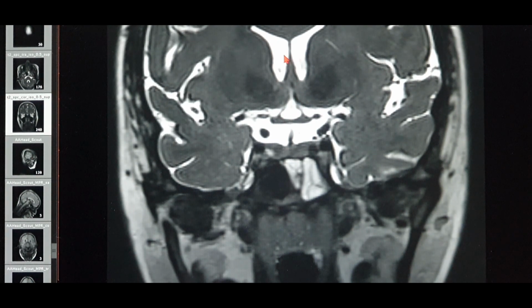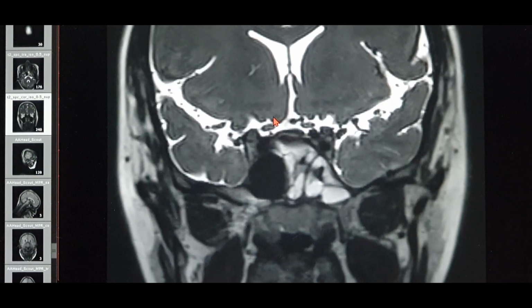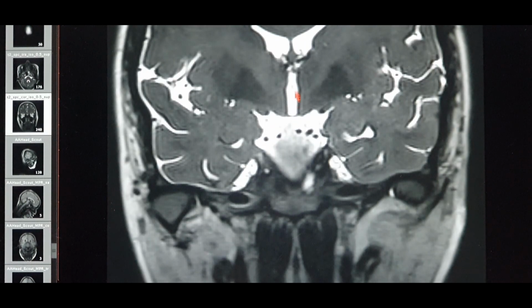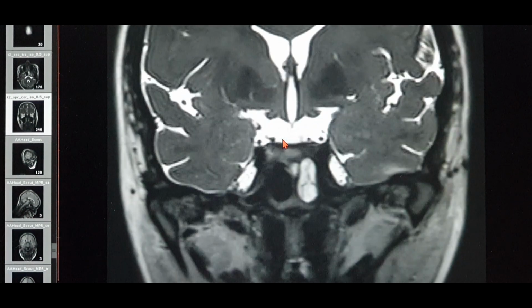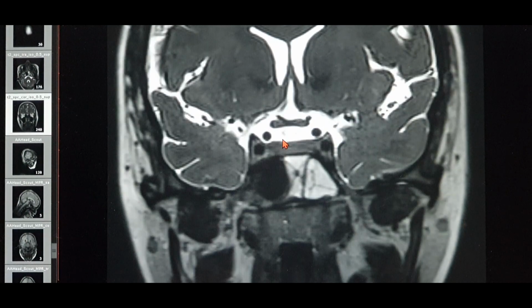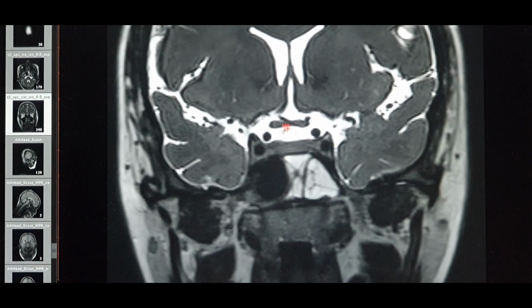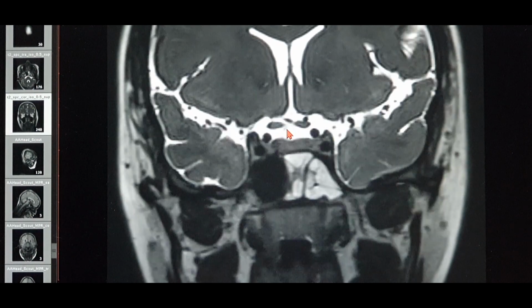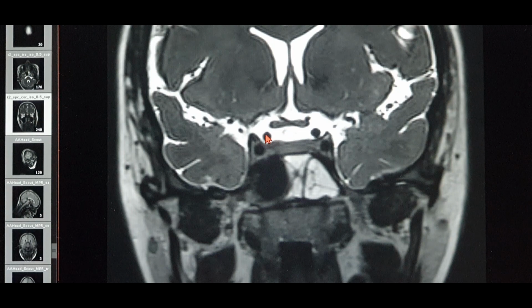These are the 2 lateral ventricles. If you go posteriorly, you can see the 3rd ventricle over here. So you can start seeing the 3rd ventricle, and that's the 3rd ventricle. You can see the 2 lateral ventricles and the 3rd ventricle. So if you want to look for the carotid artery in this section, now that's the optic chiasm. That's the right optic nerve and the left optic nerve combining to form the optic chiasm. You can see the carotid artery lying just inferolateral to the optic chiasm.